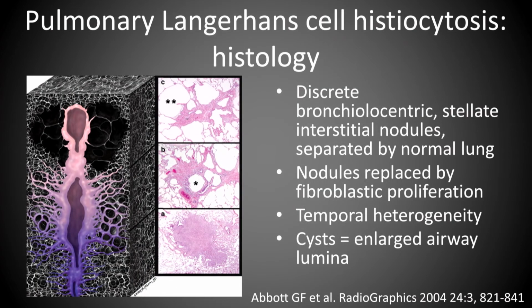Let's move on to Langerhans cell histiocytosis. Again, starting with the histology. And this is a beautiful picture from Jerry Abbott's article in Radiographics on Langerhans cell. But it took me a long time to understand what it was a beautiful picture of. So I'm going to explain it to you.